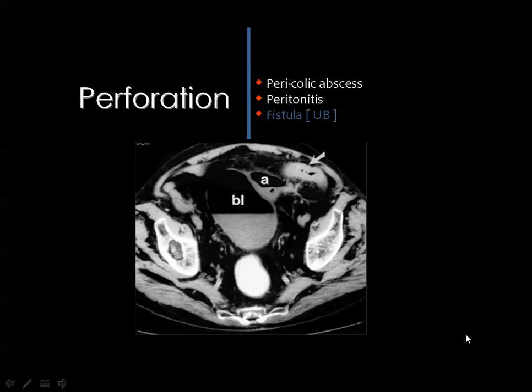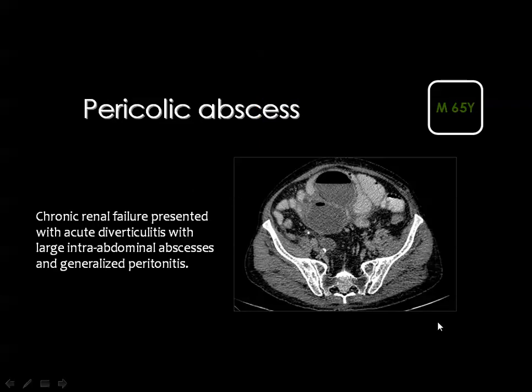This lesion is commonly presented also in the exams, where you can see the cause of the air inside the urinary bladder. It is the lesion in the colon which has perforated, leading to the formation of an abscess which has communicated with the urinary bladder.